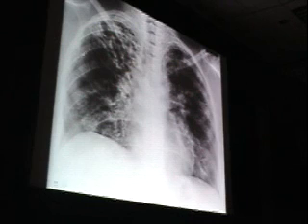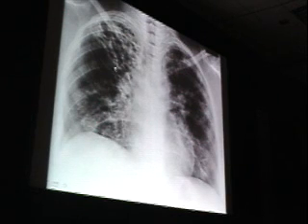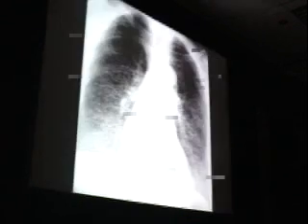Let's move on to the more interesting groups of patients. We'll start with tuberculosis. Again, we talked about the fact that it has an upper lung zone distribution. That is true in the setting of post-primary tuberculosis. That is a second infection. As you know, in post-primary, whether those are really recurrence of the original infection or a second infection is not entirely clear. But it is true that in the post-primary pattern, you tend to involve the upper lung zones with the interstitial lung disease, the apical segments of the upper lobes and the superior segments of the lower lobes as well. And these are fairly straightforward cases.